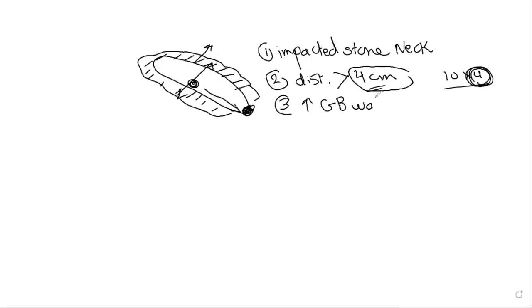And if you remember, what was the cutoff for the gallbladder wall thickness? Absolutely correct, it is 3 millimeters. So it has to be thickened over 3 millimeters. And we measured what border? The anterior border. Absolutely right. So this will lead to hypertrophy of the wall and thickening.